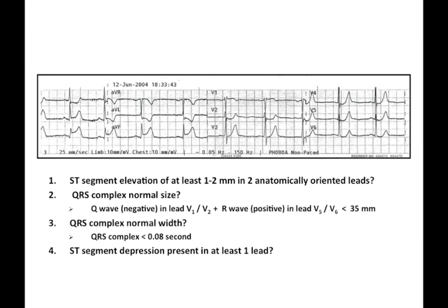Another case of a patient with chest pain. Is ST elevation present in at least 2 leads? It is. Look at leads 2, 3, and AVF. ST elevation is in fact present in these 3 leads. So the answer to question 1 is yes.